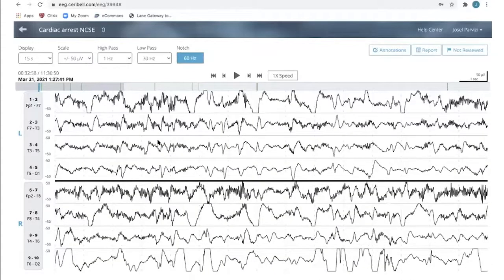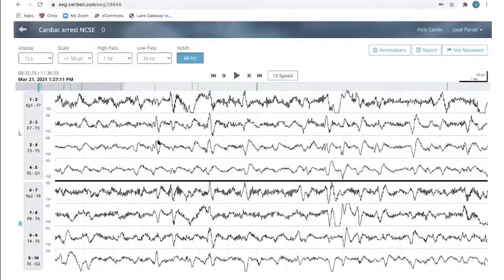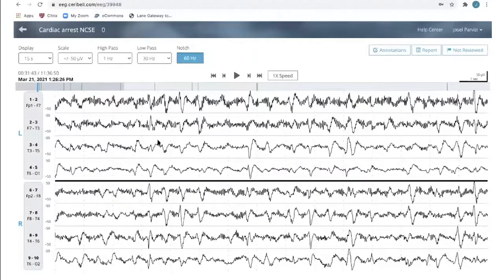Dr. Stern, do you want to take this? Sure. I was just reflecting on the pattern and Dr. Pearl's description of what he was seeing. One thing I would add is how there's fluctuation, that sometimes the discharges occur in close succession and stand out. There's a cleaner waveform. Sometimes they're gone. And there's no doubt about their epileptiform nature.